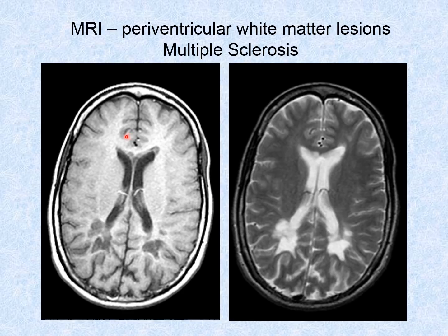We can also see on these different images of T1 and T2 weighted images, you see some indication at the head of the ventricles right here and here that we have abnormal tissue. That's actually the sclerotic tissue that is referred to in multiple sclerosis. It has multiple different locations. And then with the T2 weighted images, you can see the remarkable amount of fluid enhancement in those regions.